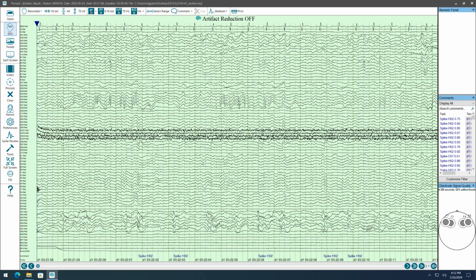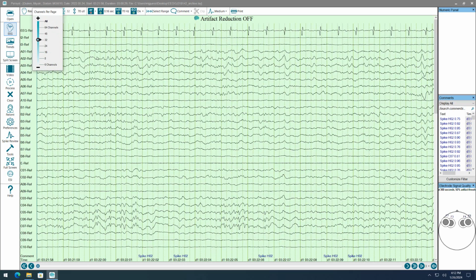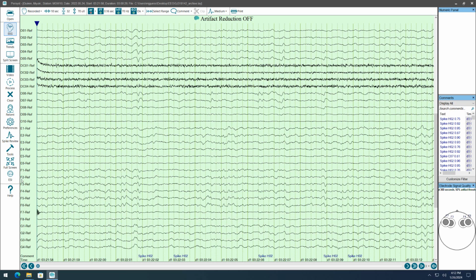All right, if we go back to the EEG, let's see what's picking up these labels that look like they are 1020 or 1010 labels. I'm going to click the All button here, reduce the number of channels. And by the way, using those labels is not a problem. It's just that the software sees those and says, okay, I'm seeing F1 through F8, this may be a mixed intracranial scalp recording, and so it prepares to do that. It just initializes the data reader in that way.